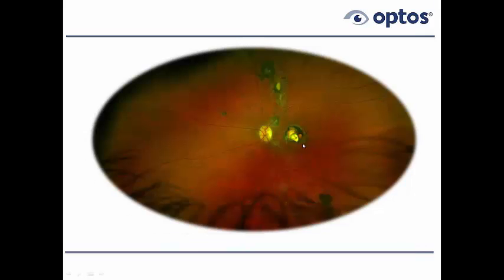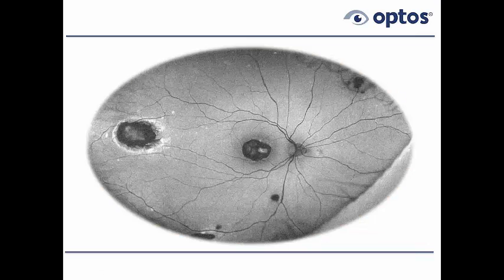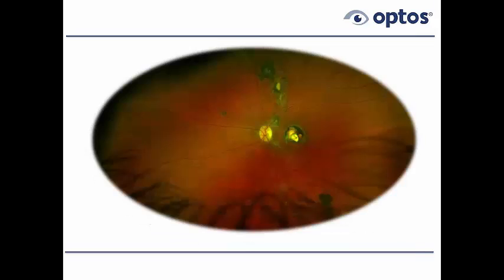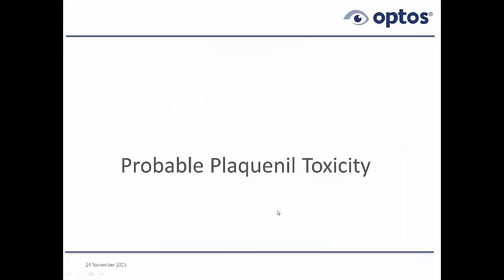Again, he was a low vision patient. The maculas are wiped out. His acuity bilaterally is 20/400. Satellite lesions here, as you can see, but nothing dramatic going on in the autofluorescence. So it looks different than this one, where there's a large lesion surrounded by a hyper-autofluorescent zone suggesting activity and something that has to be either treated or followed. In this instance, just followed. These tiny little spots here I would look at, but I wouldn't be very concerned about them. But they should probably be followed as well.